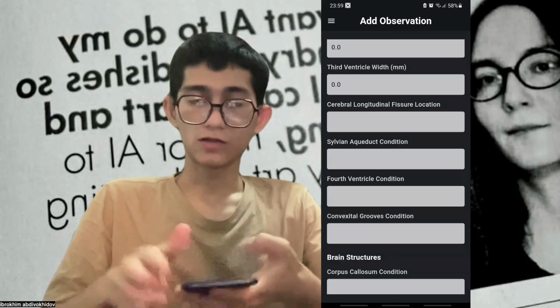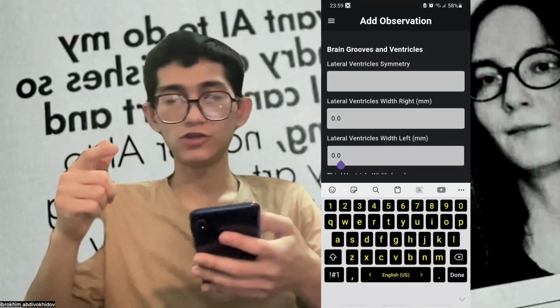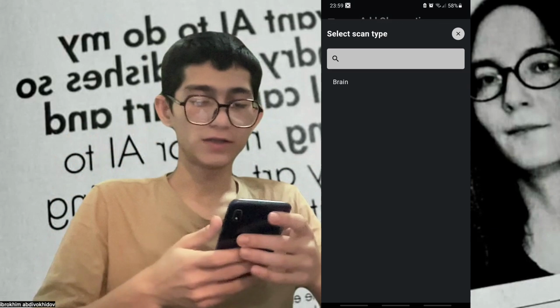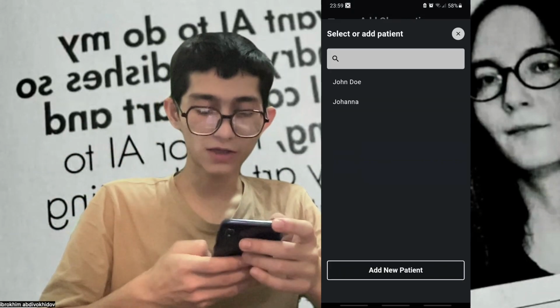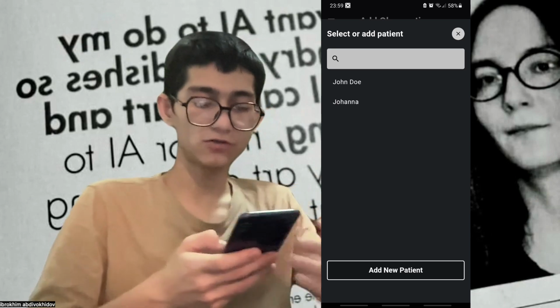Firstly, after the radiologist observes the patient and gets the brain MRI scan, select the type. We have brain MRI, and then the patient. Select the patient or add a new patient.